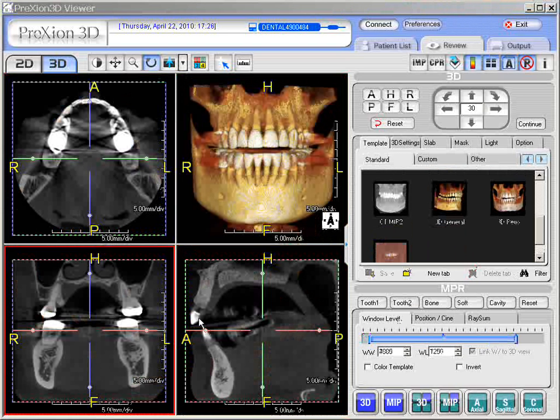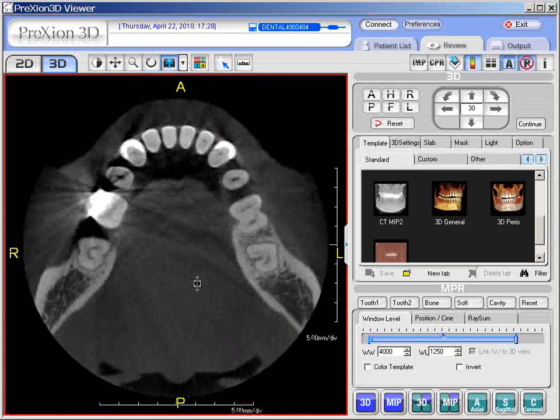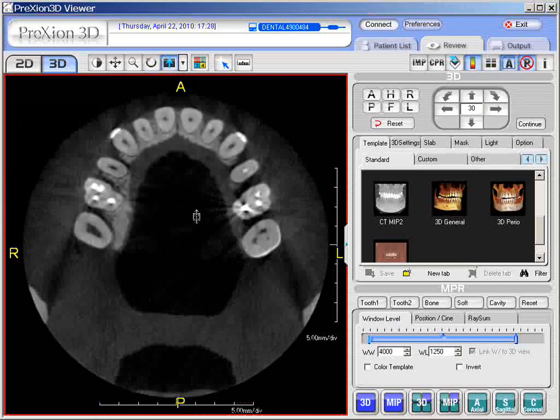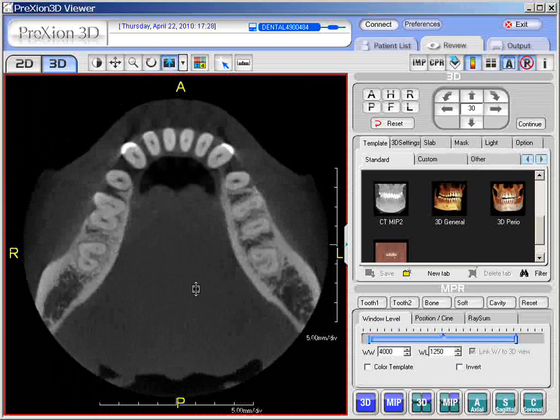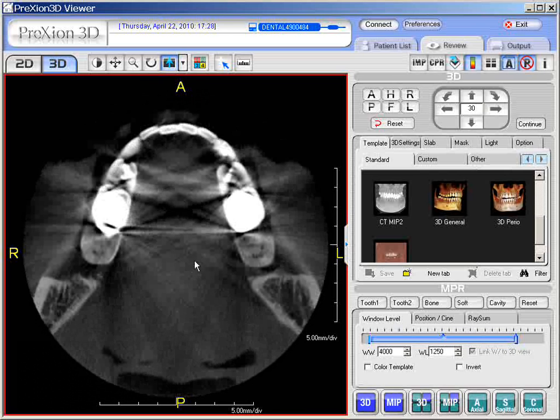Now moving over to the CT images, again axial, coronal, and sagittal screens. If we use the left click of the mouse, I'm going to double left click to launch it in single mode. If we use our left click and move the mouse down or up, we are changing the slices. One can slice the different images by just left clicking.